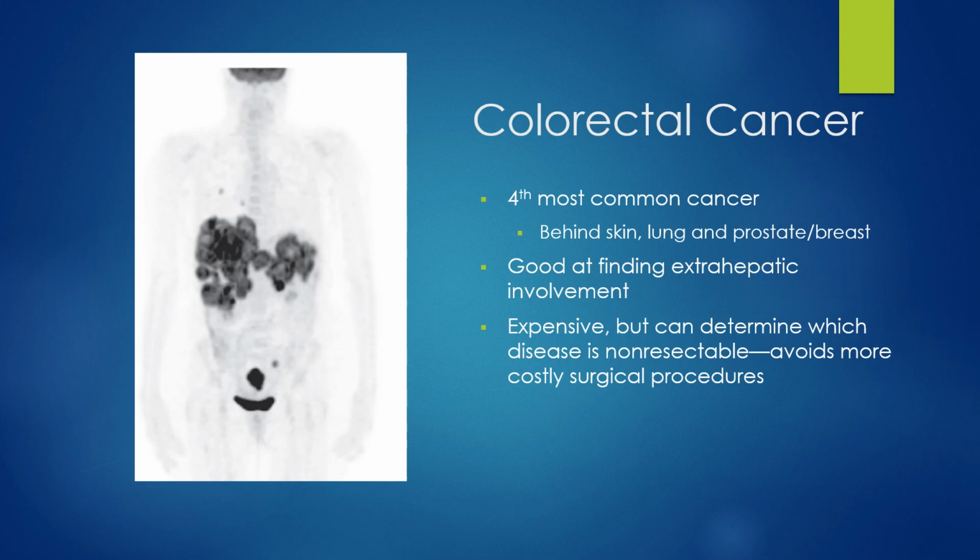This is extensive colorectal metastases with disease occurring in the presacral, left iliac, hepatic, splenic, and right pulmonary locations. Here's the right pulmonary. Of course, you see it in the liver, the spleen. Down here, you see it in the right iliac. I think that's what I said. No, I said left iliac. Left iliac and right pulmonary locations. That's what I meant to say.